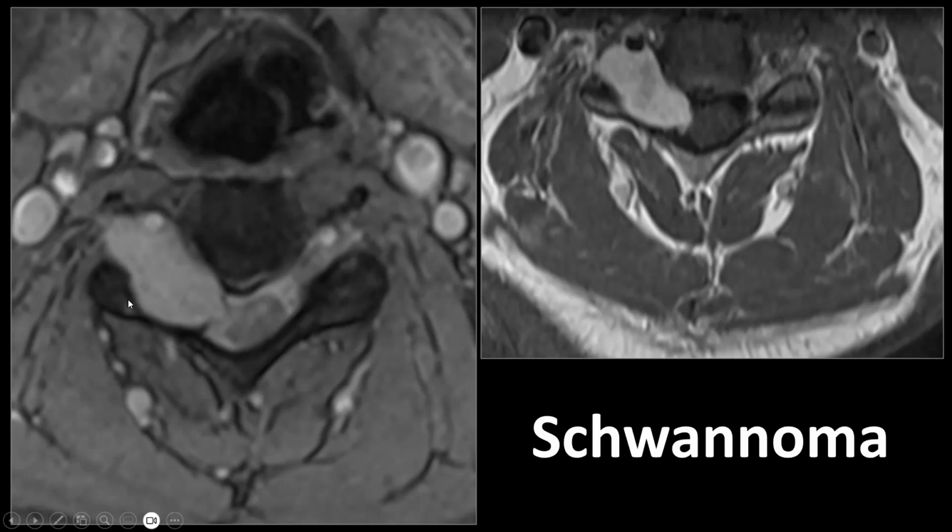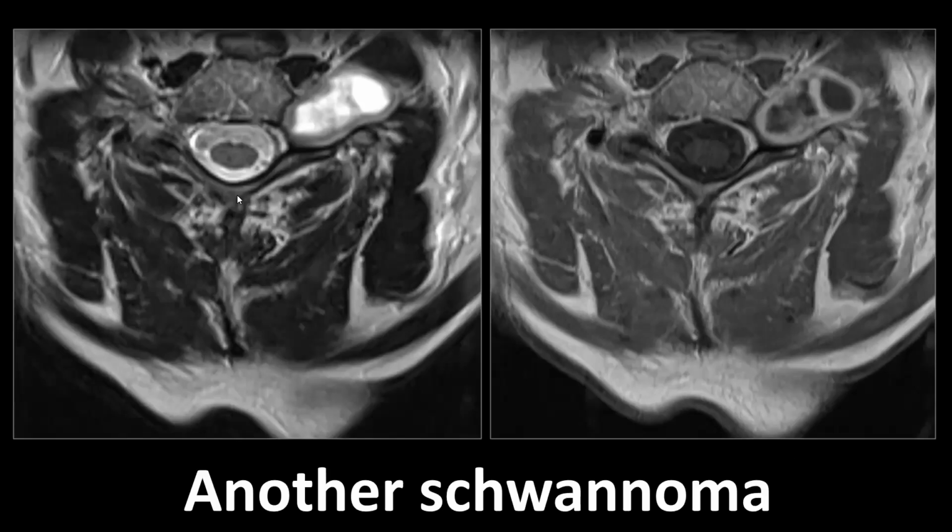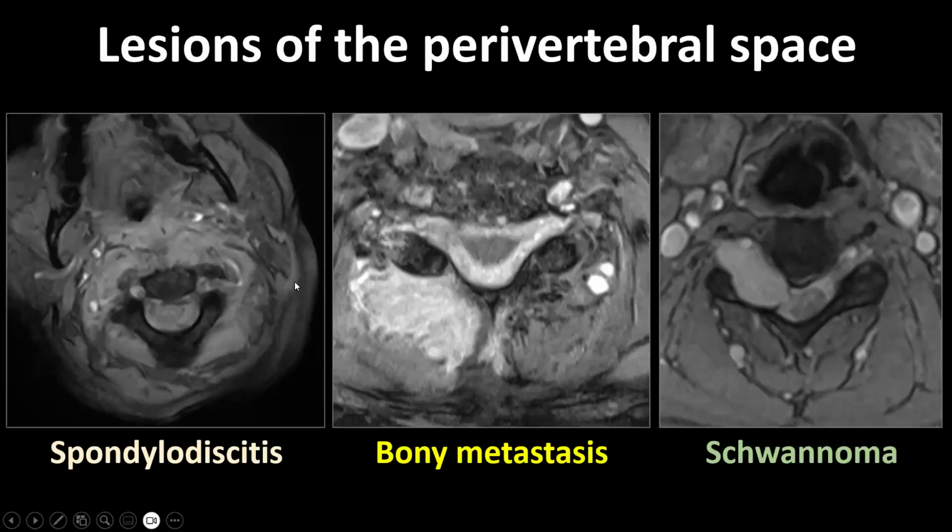Because they are slow growing and benign, they often cause enlargement of the involved neuroforamen and some benign scalloping of the surrounding bony structures. This tumor here was homogeneously enhancing, but especially large schwannomas can become centrally cystic and can have areas of central necrosis. So this is another schwannoma. Notice the enlargement of the neuroforamen and the extension into the perivertebral compartment, or the perivertebral space, in this patient.